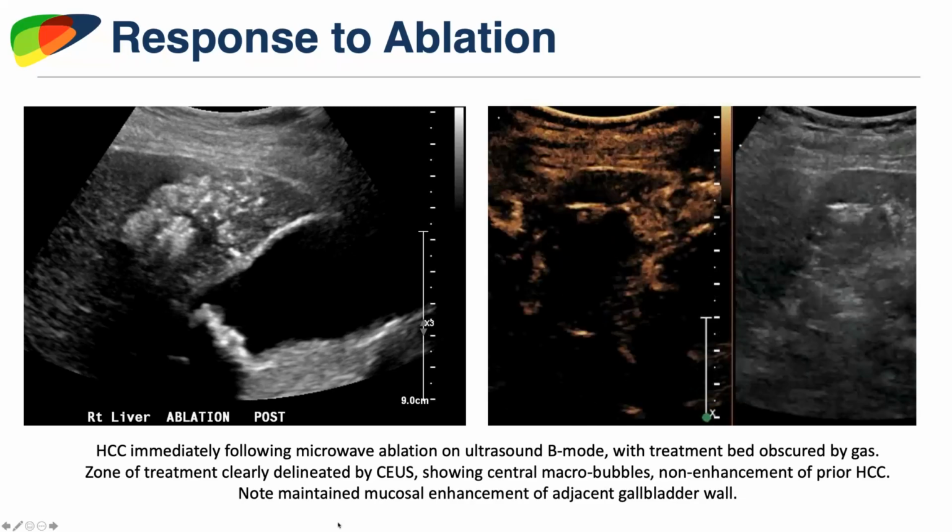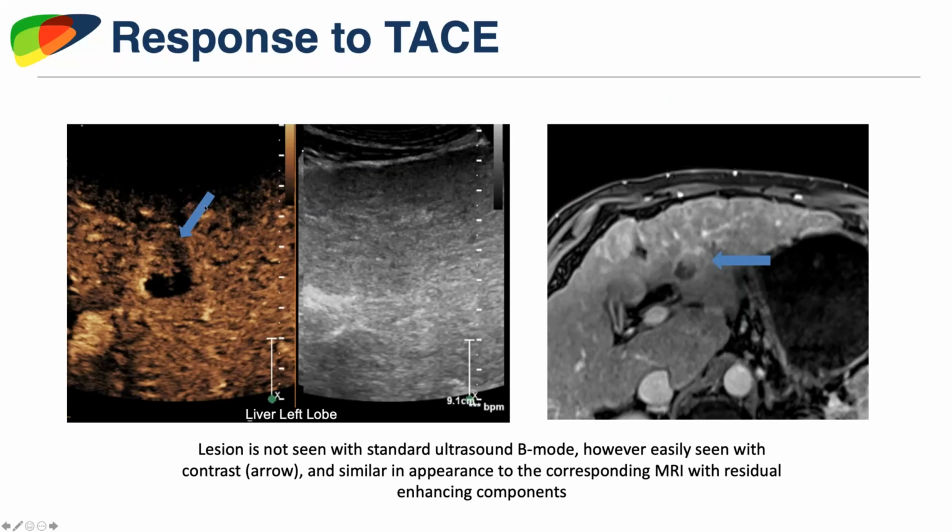We've done a little bit on monitoring observations after TACE. So here's an observation with areas of complete necrosis, but some areas showing residual viable disease. Obviously, there's no treatment response algorithm yet for contrast ultrasound, but we're hoping to develop that soon. This is confirmed by follow-up MRI.